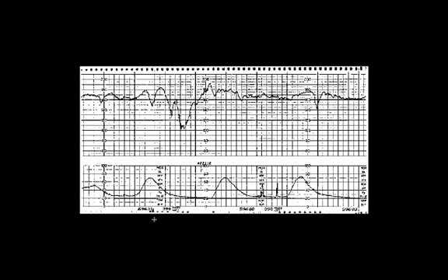Then we'll look at intensity. If this is not an internal monitor, then we cannot tell the intensity of a contraction. However, I know this is an internal monitor because I can see these little spiky lines here are very indicative of having an internal monitor. So the mom probably coughed here and raised her internal pressure a bit. Because we have an internal monitor, we can say that the baseline of the contractions, the resting tone of the contractions, is about 20 millimeters of mercury. If it goes up to 40, 60, 70 millimeters of mercury, which it does on almost every contraction, that means 70 minus 20, it's a 50 millimeter of mercury contraction in strength.